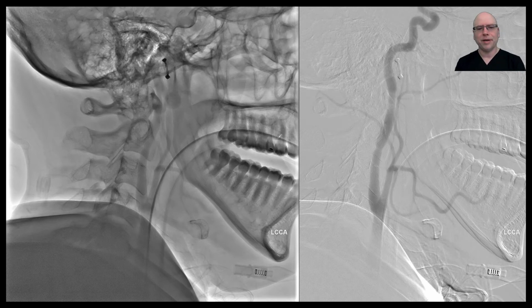What about the branches of the external carotid artery here? Maybe this is a question for Dr. Field. What branches of the external carotid artery do you remember? I know this is probably clearing off cobwebs from a long time ago, but did you ever use mnemonics or anything to think about the branches of the external carotid? So I remember the superficial temporal artery, and then you have the superior thyroid artery. There's a facial artery and an occipital artery.